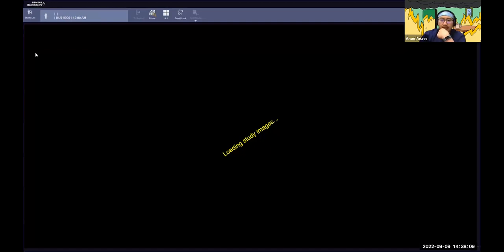Yeah, as everyone noted in the long axis, it's almost impossible to see what's going on. But with a deep transgastric, obviously, you can see that thrombus or the mass in the LVOT clearer. You can get some Doppler across it. You might even get some bit of color. But if you don't, you don't. But yeah, I guess they're trying to get every single bite of the cherry that you can, try and do it from every single view possible. Yeah, very cool. Yeah, exactly.